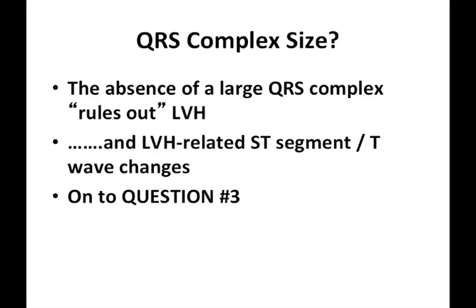So, after we've asked the question in question 2, we have ruled out excessively large QRS complexes, which means that we have removed LVH as an entity. If LVH is not present on this ECG, then any ST segment and T-wave changes are not related to LVH either. So we move on to question 3 now, which looks at the QRS complex in a different way.